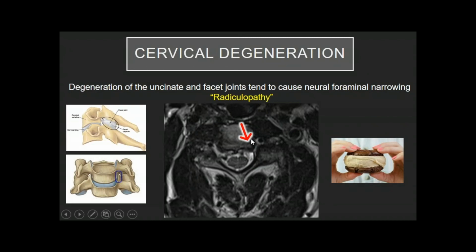So you can see this overgrown sclerotic bone. That's the uncovertebral joint. And then you have this overgrown sclerotic bone. This is the facet joint. Remember, the neural foramen goes between the uncovertebral and the facet. So you have this normal path where the nerve escapes through. But what has happened here? Because of the overgrown uncovertebral joint and the overgrown facet joint, you've got this super, super narrow pathway that the nerve can go through, and it's essentially being crushed, like in this case, an ice cream sandwich. So the nerve itself is being smushed by these overgrown joints.